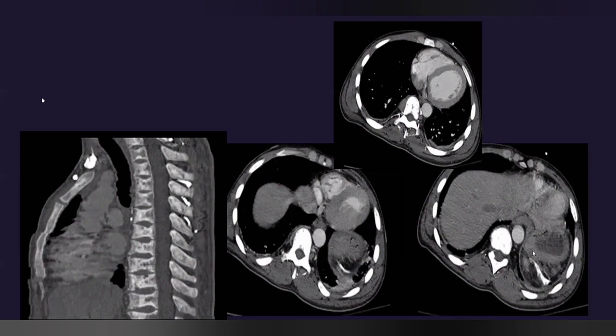This is the stomach anteriorly, right? What is posterior to the stomach? Just linear. Sorry? Calcification. Yeah, calcification. So this is autosplenectomy, basically what we call. The spleen is basically all gone, necrosed, shrunk and calcified. So you have picked up all the findings basically.